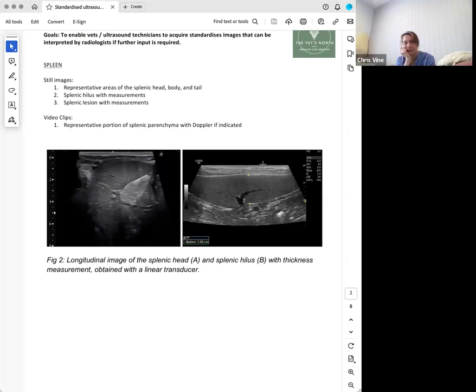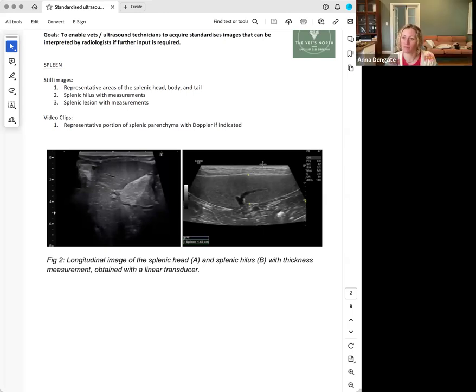Yeah. So cytology with splenic FNAs is much more diagnostic from hyperechoic nodules than from hypoechoic nodules, because hypoechoic nodules are more likely to have blood contamination or be hemangiosarcoma, which doesn't really exfoliate. I shouldn't say it doesn't exfoliate. It exfoliates well, but it's just endothelial cells and blood, so difficult to interpret. So where I'd recommend an FNA versus just a splenectomy is hypoechoic versus hyperechoic.